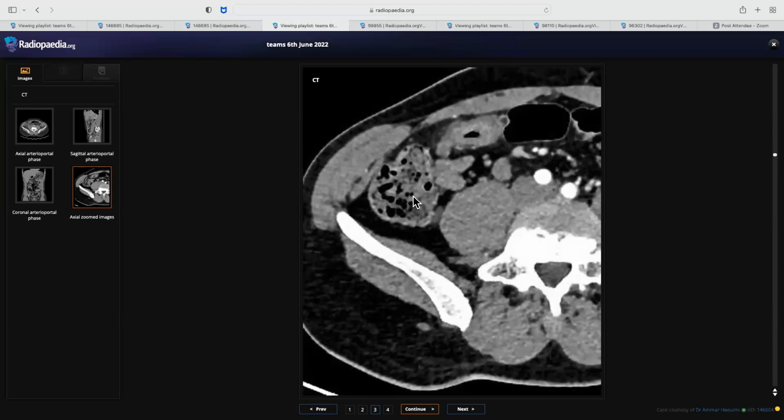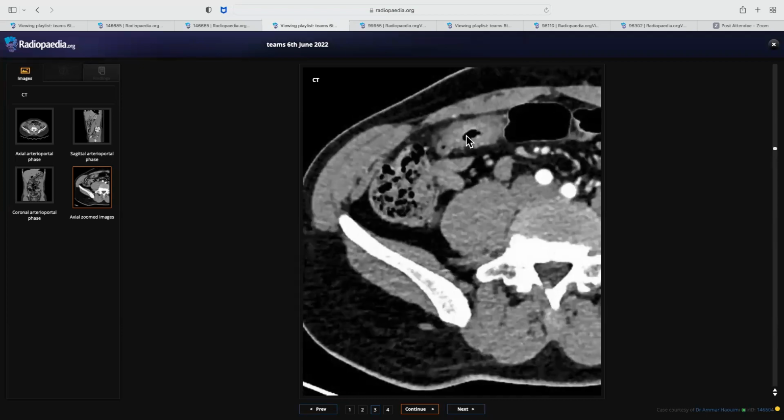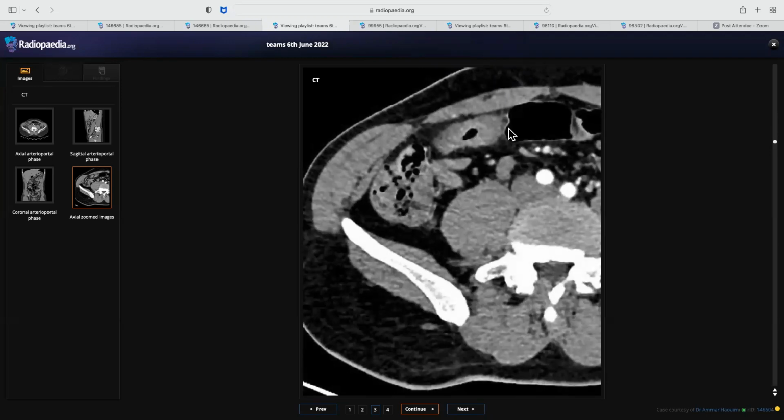Even if we are not able to pick that, at least we should see that this is more anterior. And we should say some things like, this is not fat, first of all, this is air. If you compare, fat is of this attenuation, air is this. You were right in saying that in your routine practice, you will see the attenuation. But here also in this CT, if you know this is fat and you know this is air, you can just compare by eyeballing, and you will know that this is not fat. So you can mention that the attenuation is matching air. Like that you can speak, and then if it is fat, they will say that. In that case, they will say, but it doesn't look like fat. Yeah, really that is fat, so this is matching that.